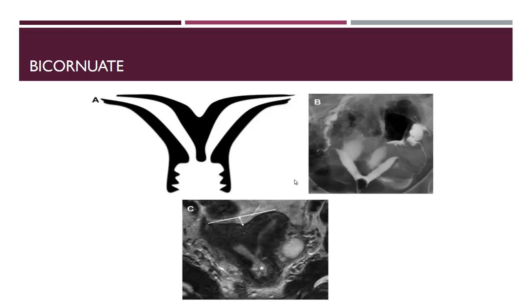In the past, we said that if it is an acute angle, it is septate. If it is an obtuse angle, it is bicornuate, but unfortunately it is not so. Sometimes we found septate but with a large obtuse angle. So don't write bicornuate or septate from the hysterosalpingography.